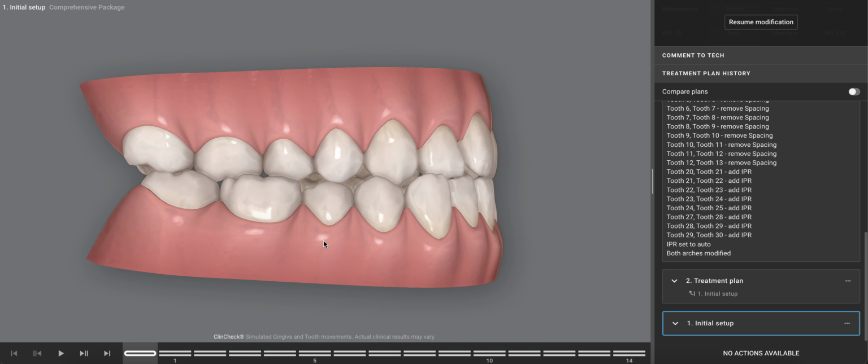But MPO is essentially the idea that we want the back teeth to protect the front teeth and the front teeth to protect the back teeth. That's a very Cliff Notes way of saying what we are trying to achieve through MPO. Back teeth protect the front teeth through MIP. In other words, when the back teeth come together, the back teeth burden most of the load in that MIP position.